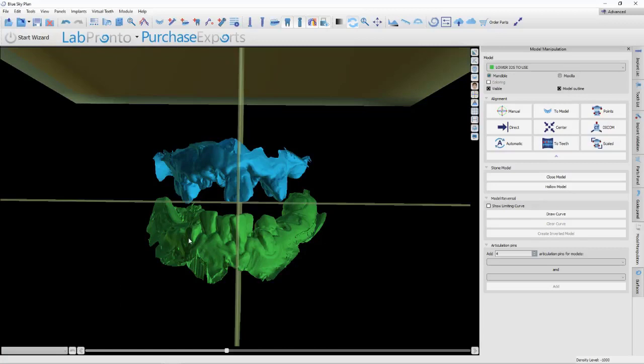Very easy. And here's an example of that. I've turned the facial scan off. Again, remember where we said her midline was? Based on her facial midline, this is where it goes. So when I start doing her digital setup, I'm just dragging and dropping teeth where the midline is here and the occlusal plane sits here. And they're symmetric side to side. That's it. It's easy.